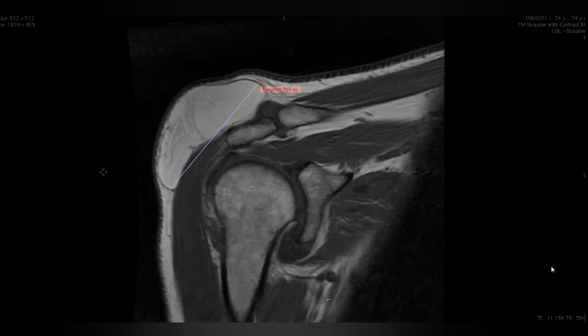Hematoma? No, this is not a hematoma. What does a hematoma look like? T1 hyperintense, sir. Okay. We need to be a little bit careful. I know what you're saying. I'm not denying that hematoma is T1 hyperintense. I have cases in my library, but I haven't anonymized them, so I can't really show you. But T1 hyperintense of a hematoma does not look anything like this T1 hyperintense.